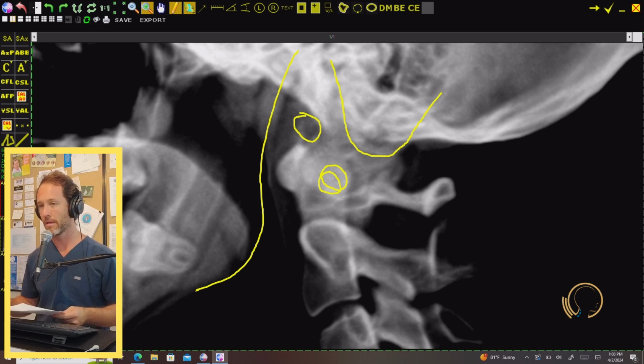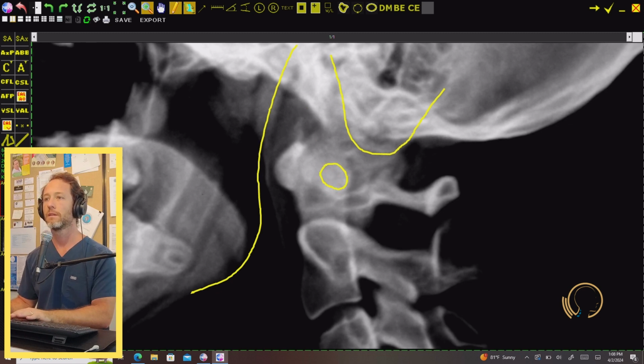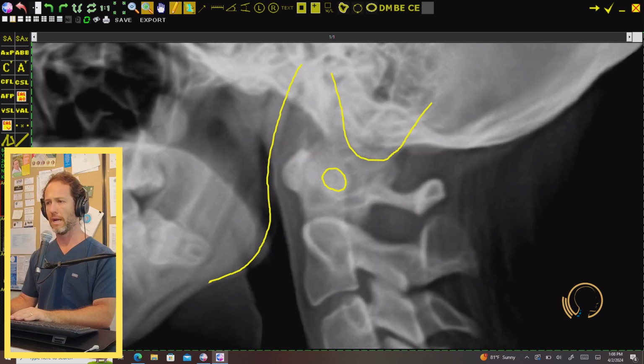Last thing, dimensional transpositioning. I mentioned it on the frontal film video, and I'll put a link for that video in this one. That is where I really covered it in detail, but the sagittal film is part of that cross-reference. So let's get this guy out of here. Dimensional transpositioning. What is that again?